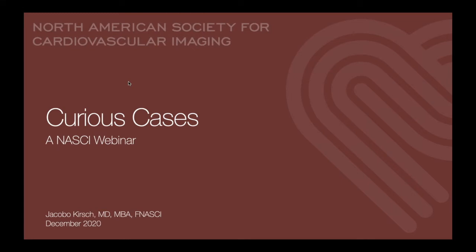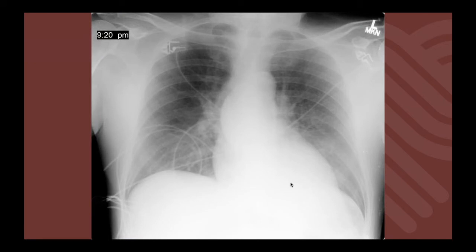So I have a case that I put together here as a short PowerPoint, and then we're just going to use the viewer to review a couple other cases. All right. So the story, I'm going to make up the age. We're going to call it a 60-year-old male.